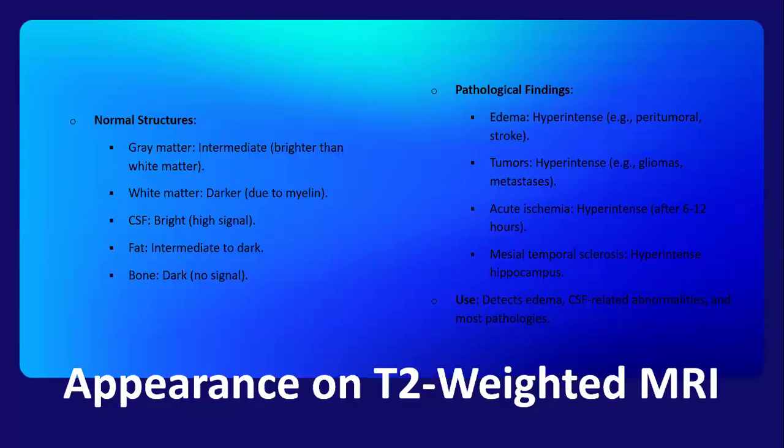So it's preferable when describing an MRI of the brain to start with the T1 sequences and go in order while describing the anatomical detail. Then T2 would be able to describe the pathology. On T1, you'd still be able to see the pathology. So what is expected is that on T1, you go through the anatomy in detail as you go through the various levels of the brain, look at where the pathology is, and discuss the appearance. Is it hyperintense? Is it hypointense? And it is relative to what?